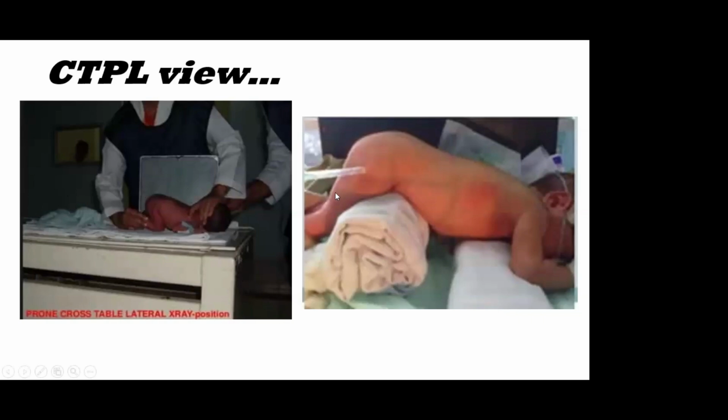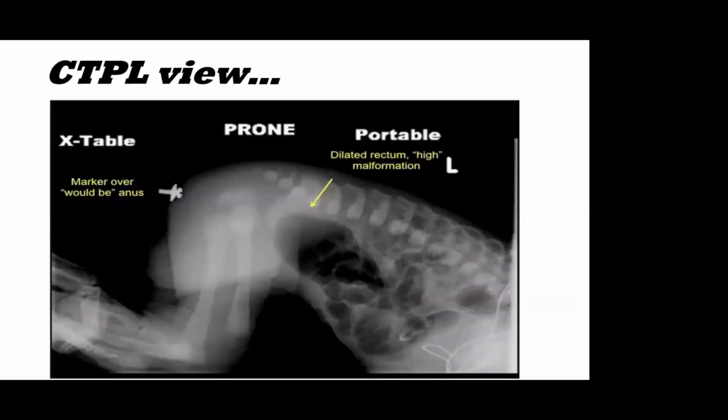When you take an X-ray, generally it is only for anorectal malformation. So a marker is placed where the anus would be, mainly for anal atresia or imperforate anus. So where the anus should have been, the marker is placed. This is the kind of X-ray it is going to show. This is where the marker has been kept, and you should see the blind end of the loop of the intestine.